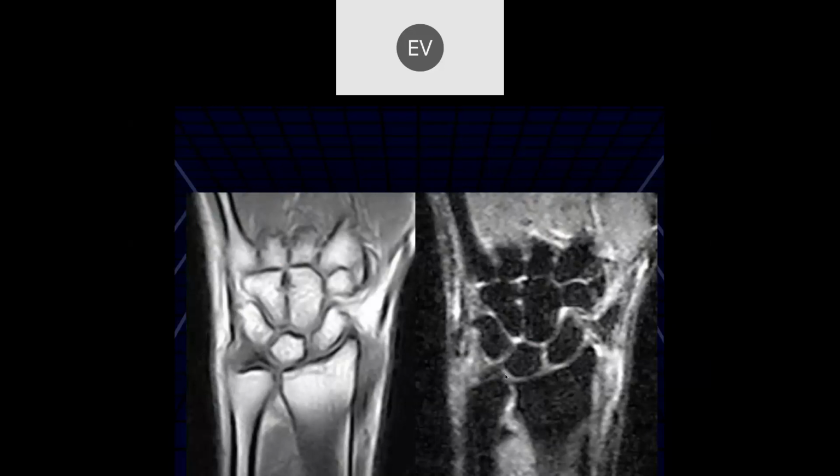All right, so here looking at that first extensor, I've got to throw in the requisite low field studies. Aren't you glad you guys don't read a lot of these anymore? Yeah, it's very indistinct, those first extensor tendons there by that distal radius.